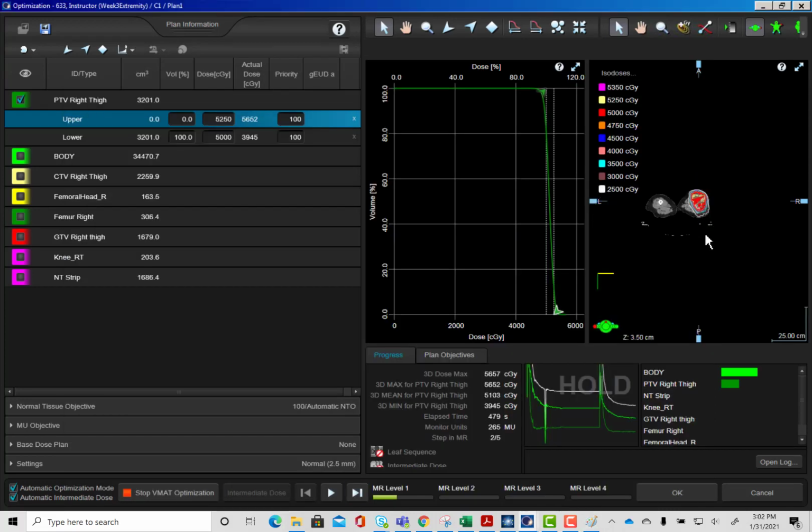So it's hard to notice on this leg because it's pretty simple, but if you do a prostate plan or something, you'll see, if you look at really low isodose lines, like 1,000 centigray or something, it'll look kind of like a static IMRT plan. You'll have these streaks of low dose, and that's because you're at this low resolution level, and it's split your full arc into these 10 different segments, okay?